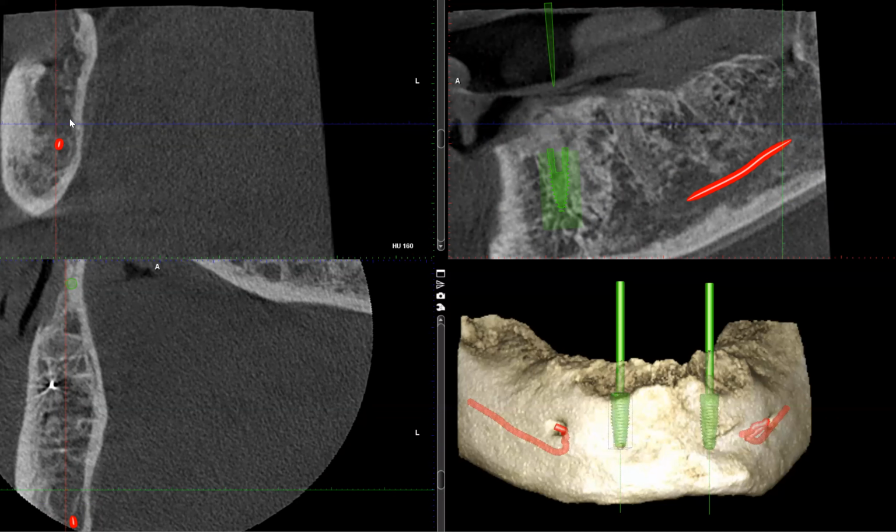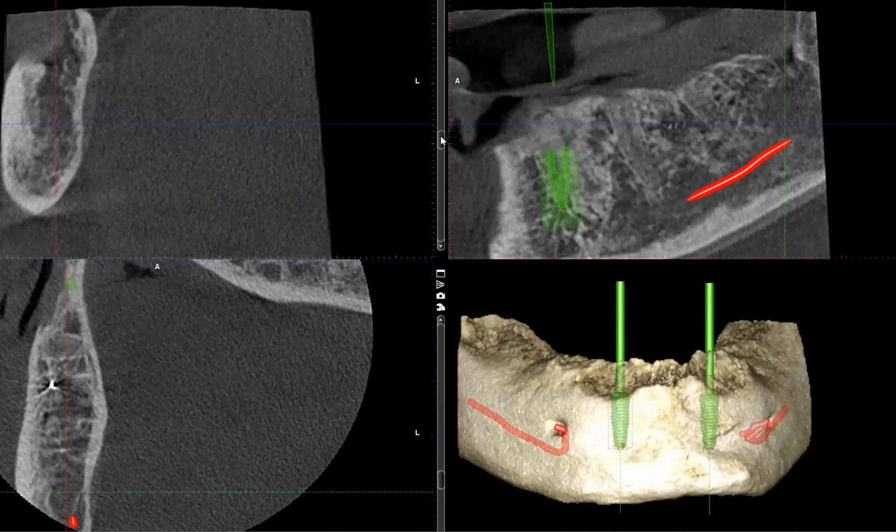So focal osteoporotic marrow defect, or just marrow spaces, right? A collection of large marrow spaces, which would not require any further investigation or treatment. But I think it's nevertheless important to see that and go through your mental diagnostic tree that you have to say that this is normal or abnormal.